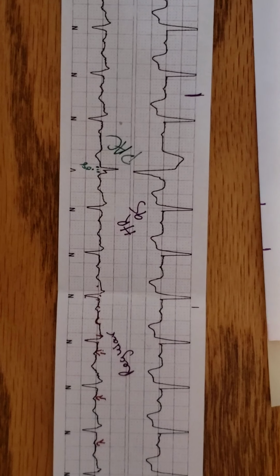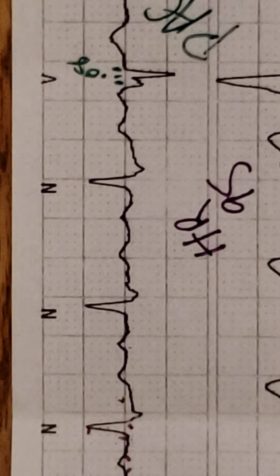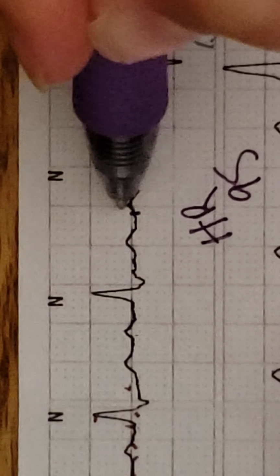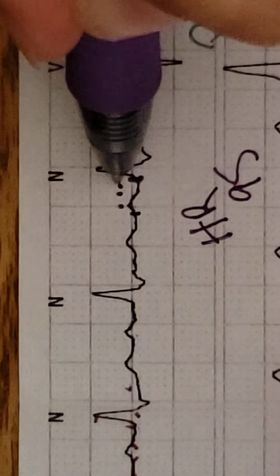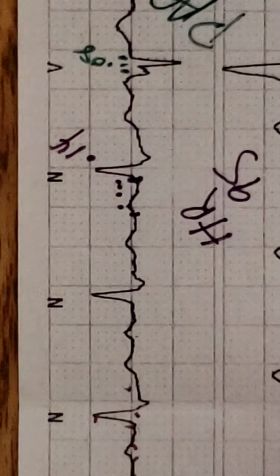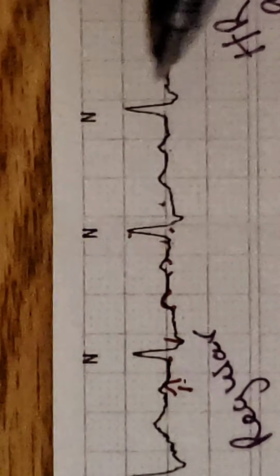I'm going to try to zoom in for you, and let's see if we can get to some of these PR intervals. Okay. So looking at this one here, P wave begins, QRS begins. We've got 4, 8, 12, 14. So 0.14 there. And then our QRS, we'll pick a different QRS to look at to make it a little bit easier. Since I'm writing on it, it won't get in the way.